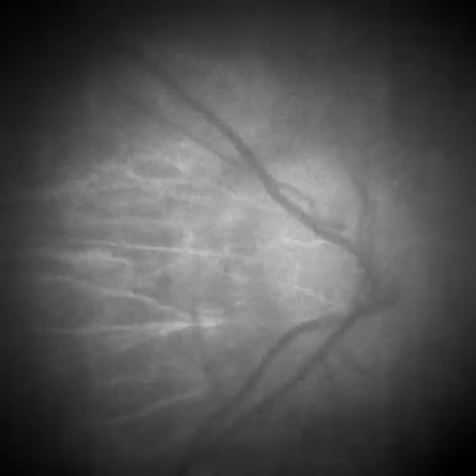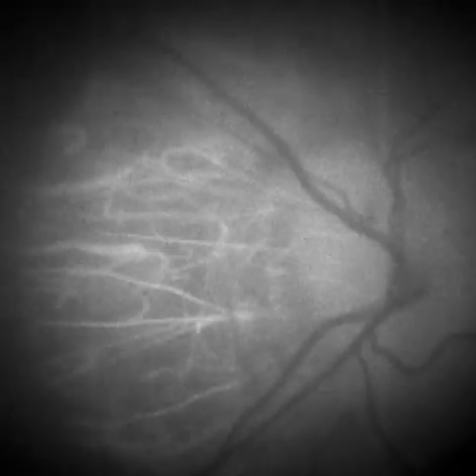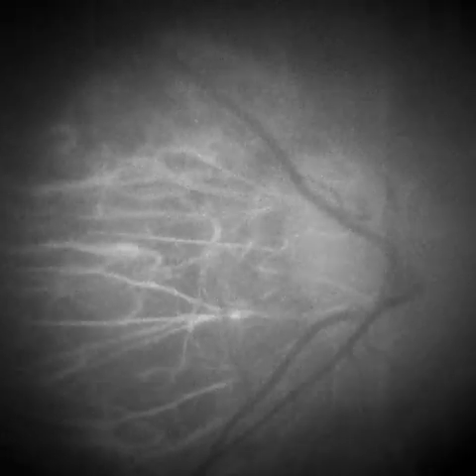Second, the temporal transform of a 32-frame batch of holograms is done by principal component analysis, which is achieved in practice by data eigendecomposition. The cuBLAS and the cuSOLVER libraries were used for these matrix operations. In particular, the construction of a covariance matrix of a batch of holograms, its eigendecomposition, and the projection of the result into a subbasis were performed in 3.10 milliseconds.